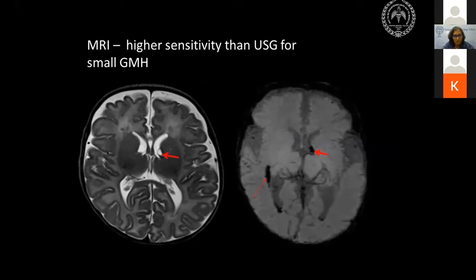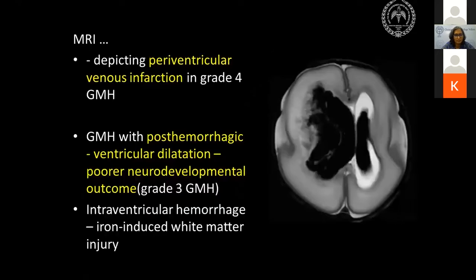So this is an MRI T2-weighted scan in a neonate performed at term equivalent gestational age. We can see a small cystic area at the caudothalamic groove region. And on SWI, we see that there is blooming here, indicating that this was a small hemorrhage. And again, we also see other areas of hemorrhage along the ventricular margins and minimal blooming within the occipital horns of the lateral ventricles.